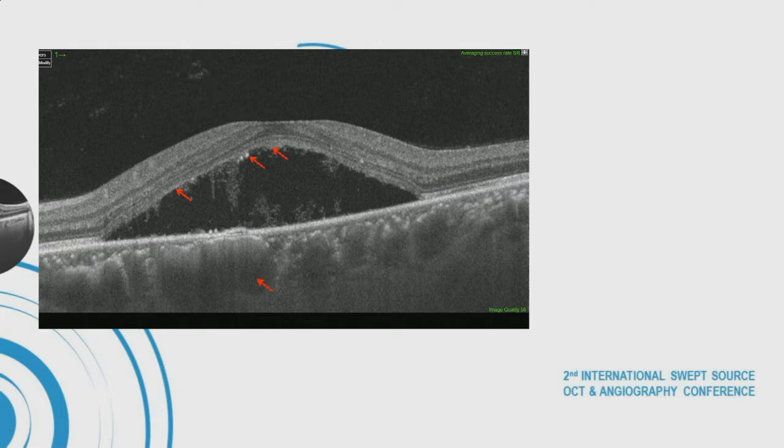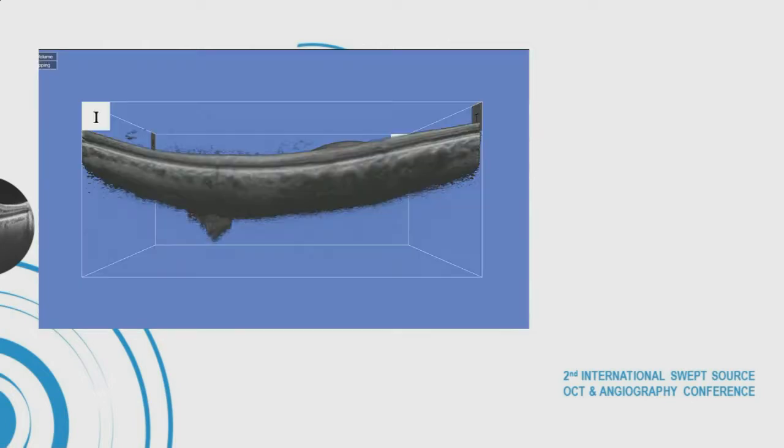And we have a huge choroidal vessel right underneath a small pigment epithelium detachment. And furthermore, here is a strand of fibrin that is connecting down to the pigment epithelium detachment. So this must be central serous chorioretinopathy. And let's look at it in this 3D rendition produced on the Topcon Triton.